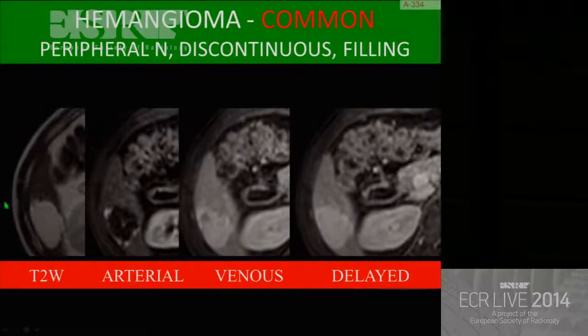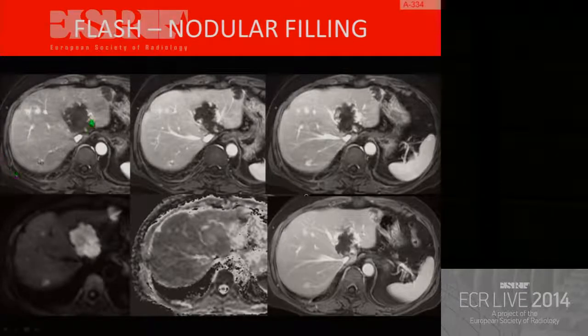Can we have an additional value from MR imaging? Yes. In addition to the vascular diagnostic information, it is very bright on T2 weighted images. So this can help us in difficult cases. How about this patient? This is typical hemangioma, peripheral nodular enhancement, and you can see flash-filling hemangioma. So flash-filling hemangiomas are different than the cavernous hemangioma. You can see enhancement, diffuse enhancement, and they keep the contrast on the venous phase. So this is also fairly typical for these kinds of hemangiomas.